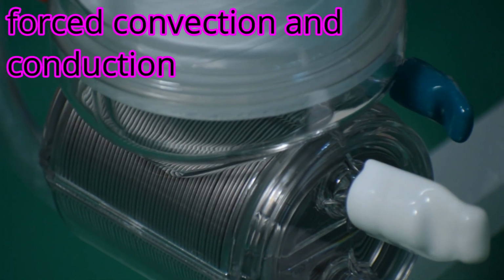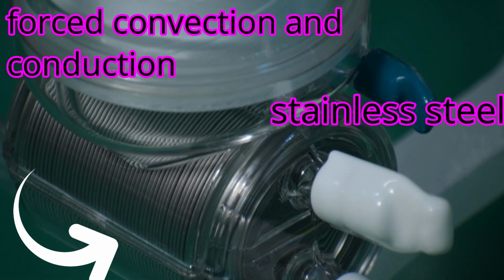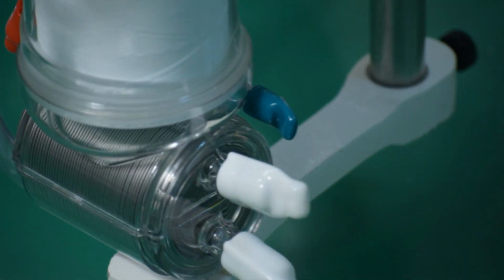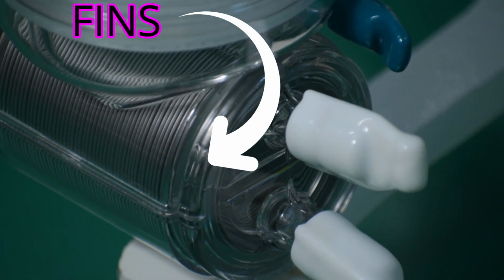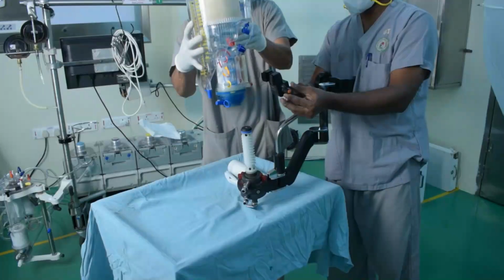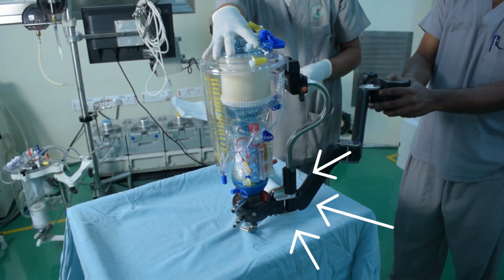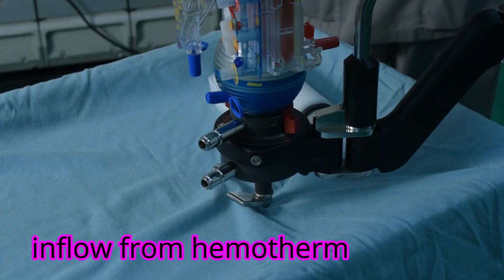Within the CPB heat exchanger, the major forms of heat transfer are forced convection and conduction within the stainless steel. Now, these heat exchangers are integrated into commercial oxygenators to permit out-of-the-body cooling and warming of the bloodstream by varying the water temperature flowing into the heat exchanger. The exchange surfaces typically are made of stainless steel or aluminium and have fins to maximize the efficiency. In case of the Lilliput or the oxygenator used in pediatric age group, the heat exchanger comes as a separate unit and has to be accommodated into the oxygenator. So the heat exchanger and the oxygenator are two separate units which after assembling form a single unit.